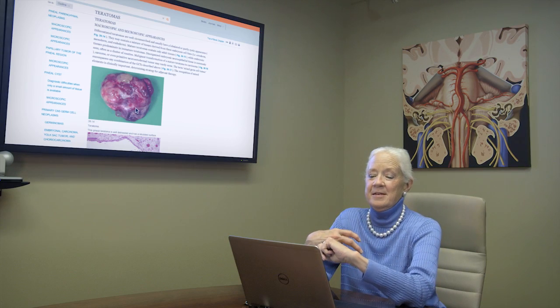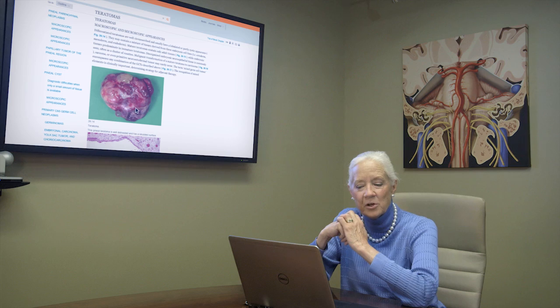By putting together the imaging differential diagnosis and coming up with our most likely diagnosis based on the imaging studies, and putting the clinical and pathologic information together from Clinical Key, and finding exactly what it is that we think we're looking for, we can tell the neurosurgeons that we are almost surely dealing with a benign mature teratoma, that further imaging of the neuraxis isn't necessary.